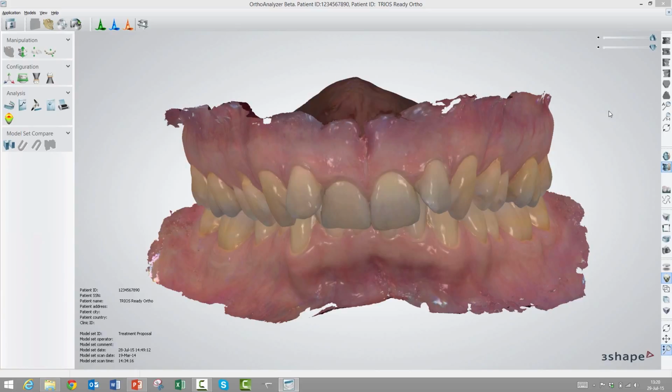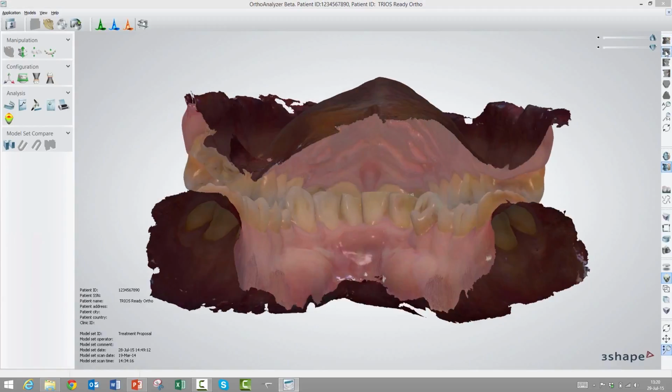So next up is how you use all the 25 tools in the visualization toolbar, and I'll take them from the top. The first 6 ones here allow you to see your model that you have in the main session window here in a certain angle. They are almost self-explanatory. The first one here is the front view. The second here is the rear view, and you'll see it simply turns around. You could also have done this with a mouse, but sometimes it's easier simply to click on the view button here to get a certain view.